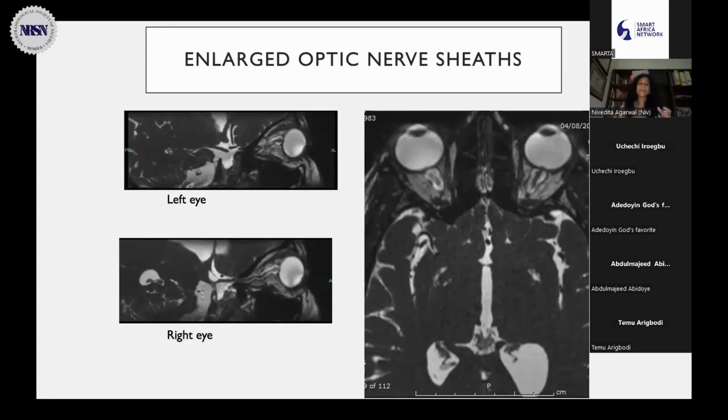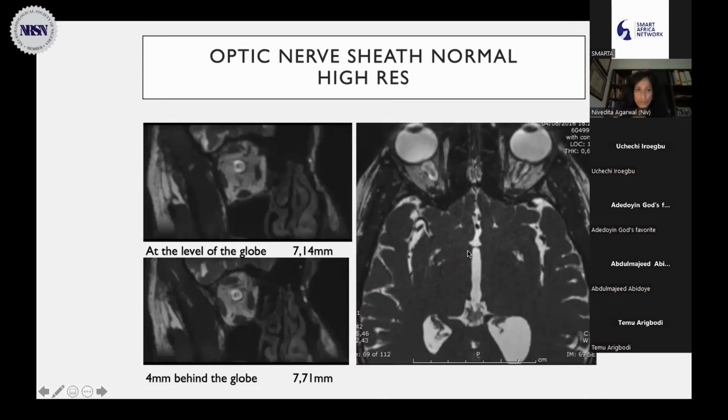This is basically those indirect markers that I was telling you. Ventricles are fine. Somehow the CSF is trying to make space into wherever it can, wherever it finds, you know, weak, less resistant pathways. And that is why this patient has this. Basically, there is ischemia of the optic disc, and therefore she has visual loss. And in fact, this patient went ahead.